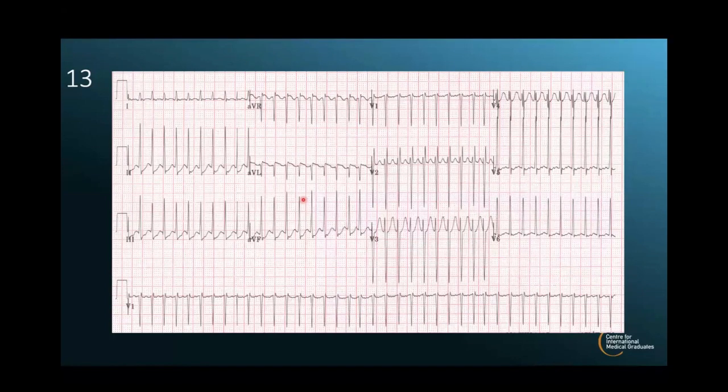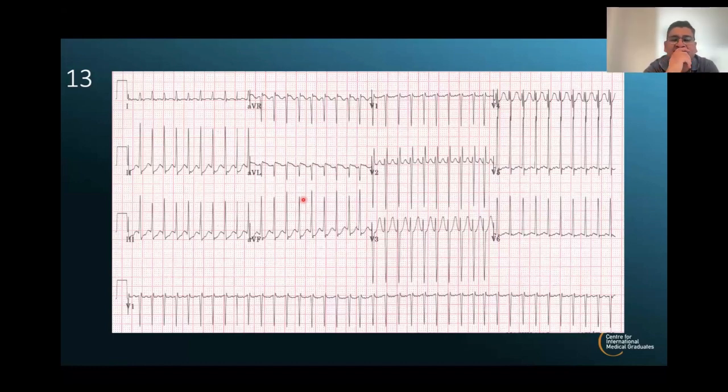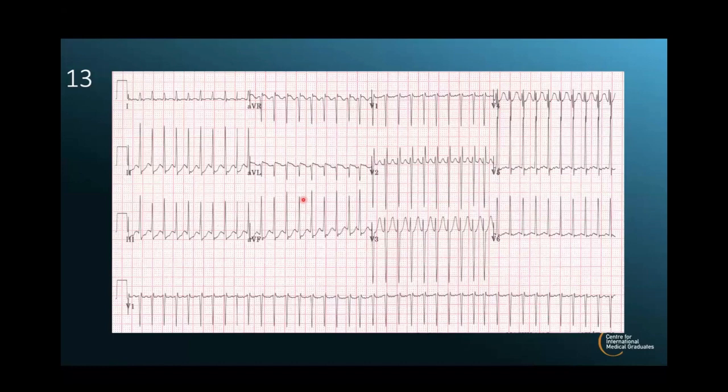My name is Lisa, and another option I would suggest is atrial flutter with one-to-one conduction. How can you tell that? Well, it's very regular, and as far as I remember, the usual maximum flutter frequency would be 300, and we have 300 here as far as I see. So that's what would make me think about that.